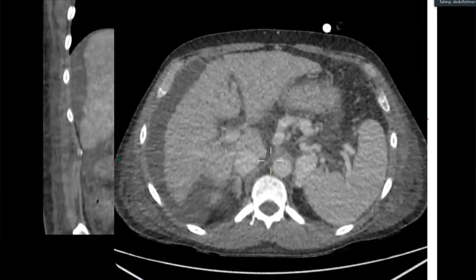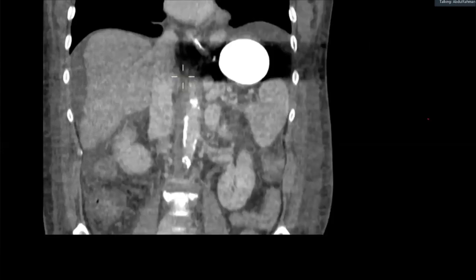The patient has chronic liver disease with ascites. And with that knowledge, if I told you the spleen was enlarged, what are these? These are varices, splenic varices. Excellent. Now we've identified these are varices. Let's come to your friend over here. Have you ever seen this before? This patient has varices. CT scan has been done.